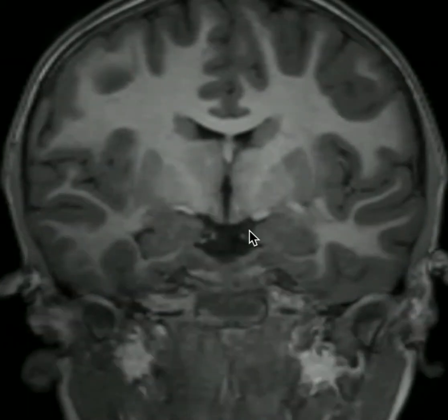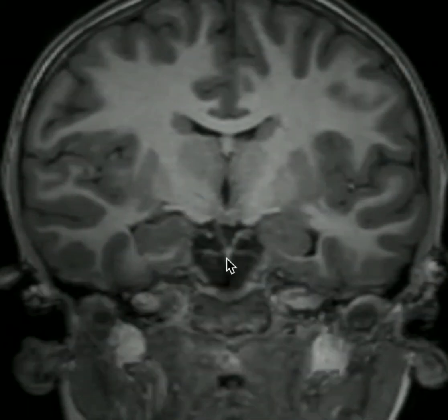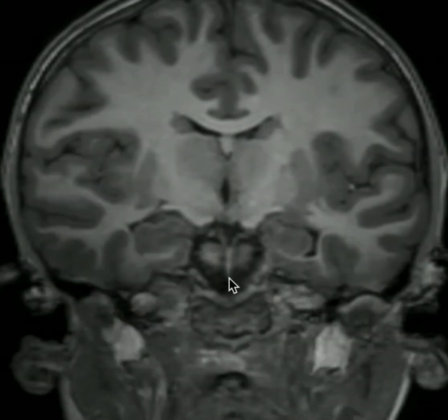Next, I'll point out the basilar artery. The basilar artery, which we're beginning to see right here, has these superior cerebellar arteries and then finally these posterior cerebral arteries forming its last branches. If I go one slice more posteriorly, we'll see the basilar artery in better profile. The basilar artery is a useful landmark for identifying the anteriormost aspects of the hippocampi.